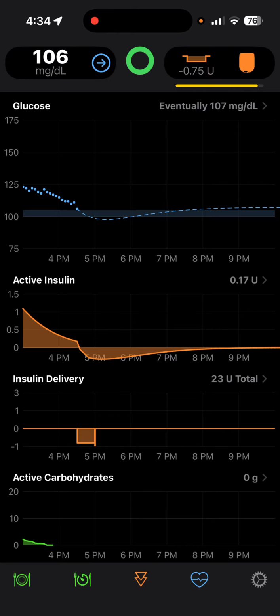Well, I'm really excited to tell you that I rebuilt FoodFinder to support Loop version 3.10.0. And in doing that, there were some exciting changes that we made that I want to highlight for you and demonstrate for you. But let me first start with a basic demo of FoodFinder.